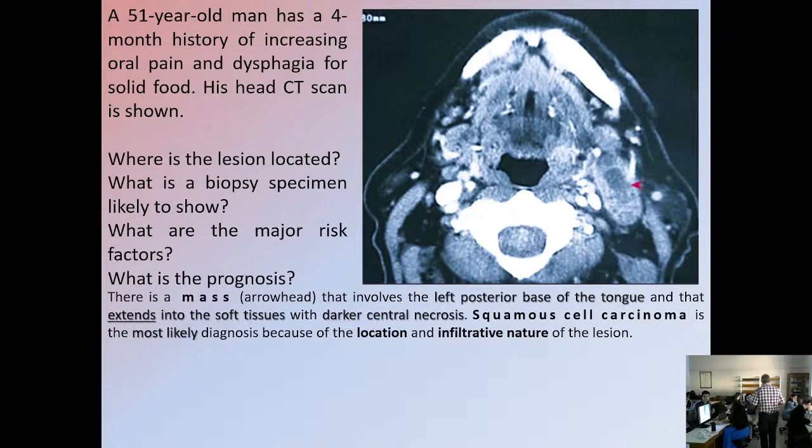Of course, you should take into account that if the necrotic lesion affects lymph nodes, this is not necessarily a sign of malignancy. Why? Because quite a lot of inflammations in the lymph nodes, known as lymphadenitides, are necrotic without being malignant.